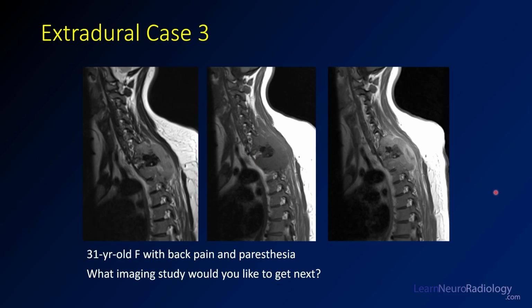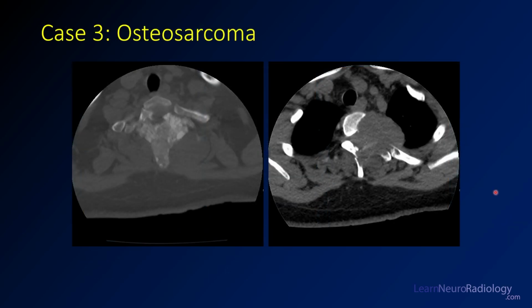Let's think about looking at a CT. So here are some images from the CT. We've got a couple of axial images. This is kind of a higher image with a bone window. What you see is some posterior elements here. You see marked thickening of the lamina and transverse process. You see some new bone formation probably here, or bone deposition.